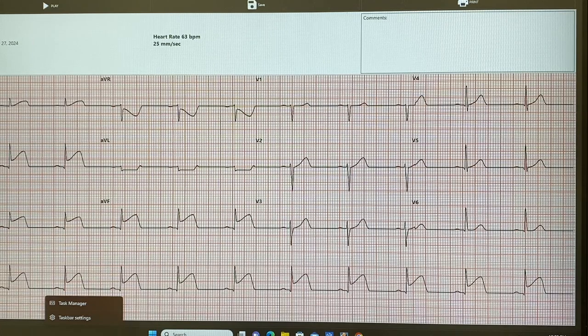Ami, if the ST is elevated, what's the problem? What are we looking at? Look at your notes. ST elevation, ST depression, what do those mean? We talked about when elevated or depressed, we're looking at underlying causes of the MI or ischemia. Correct. So which one is which? Elevated would be MI. That's right. So this is a STEMI.